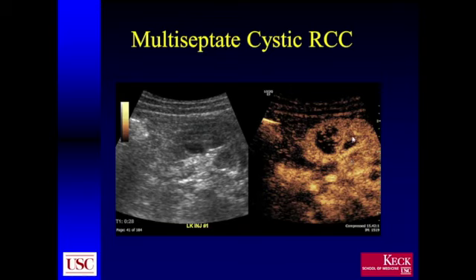In this particular case, again, the more solid material you have, obviously the worse the prognosis. You can see the entire upper outer portion of this lesion is solid and enhancing. There is nodularity. There is a thick septum here with abundant flow. One of the things that retrospectively, if you look at the grayscale on this, there's a lot of artifact in this.